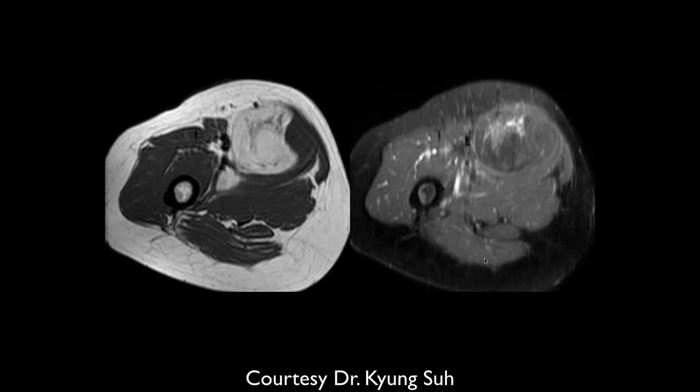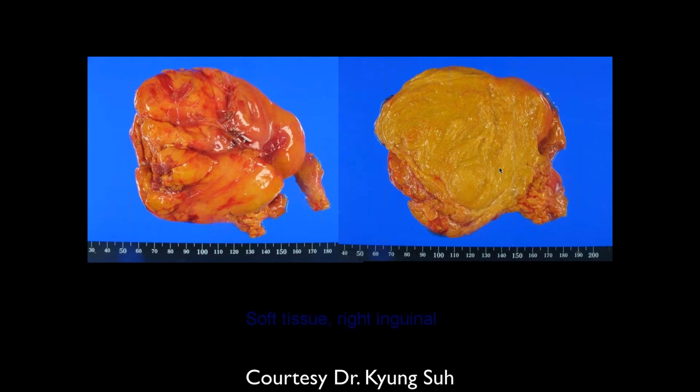I wish we had a fat-saturated image to show whether that enhancement or increased signal is actually increased from the pre-contrast. I agree with you. If that's the case, that would be just mild enhancement of the central fibers. I guess liposarcoma could not be entirely excluded given the size and maybe some internal elements.